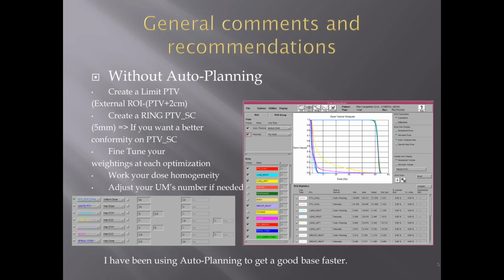And you start again 20 iterations, and you observe. And you fine-tune again, and you start again 20 iterations, and you observe. And for me, that's my process to win points for this plan challenge, and to satisfy all your criteria.